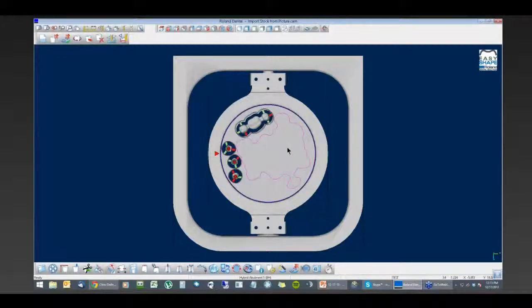So that's another trick. When you're taking a picture of the disk, you want to get the picture of the disk in the orientation in which it's going to sit inside the machine. If it pulls in sideways like it does here, we also have the option of rotating the disk, which is this button right down here where it says rotation of the blank. Once we click on the rotation of the blank, we'll get a dotted line that comes right down through the middle and also across through the disk.